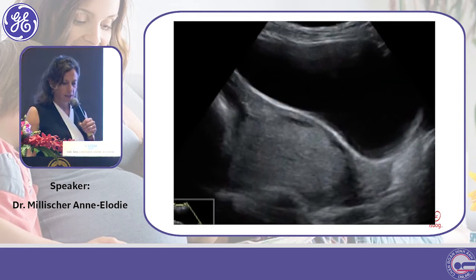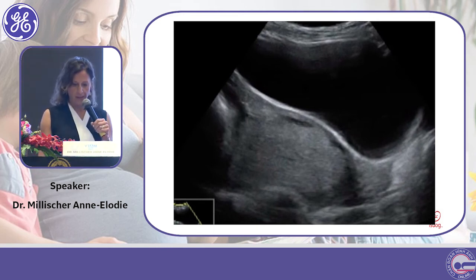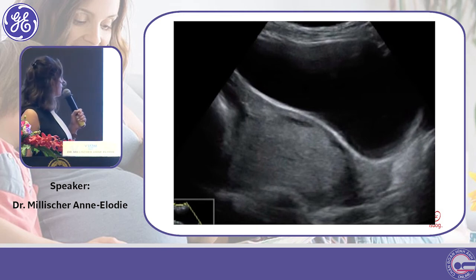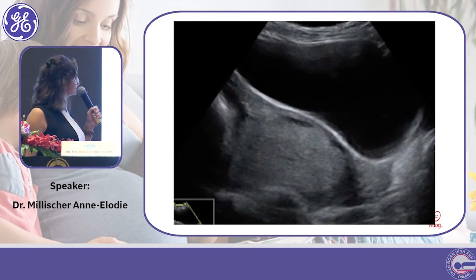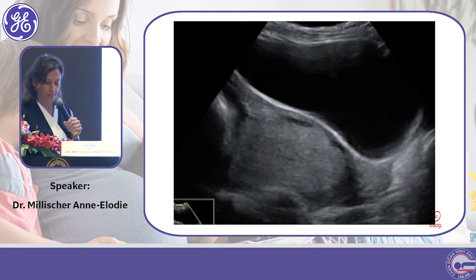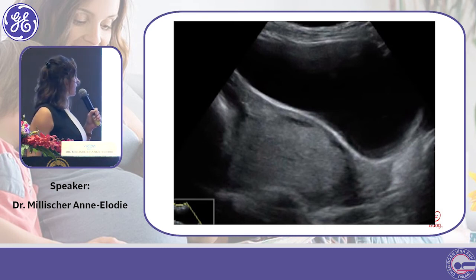And the last point will be bladder wall abnormalities. Và cái đặc điểm cuối cùng là bất thường cái thành bàng quang. With this hypertrophy of vessels in the interface between placenta and bladder. Mình mất đi cái interface, cái giao diện giữa cái tử cung và cái bàng quang. You could have this aspect within Percreta. Các bạn có thể được cái hình ảnh như vậy ở trong cái thể Percreta.